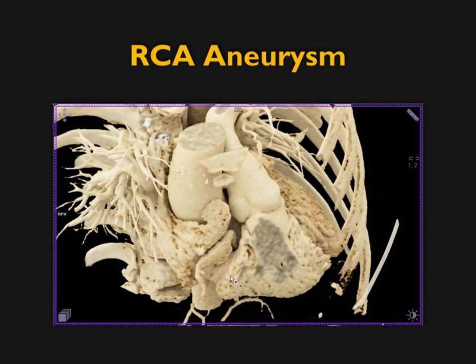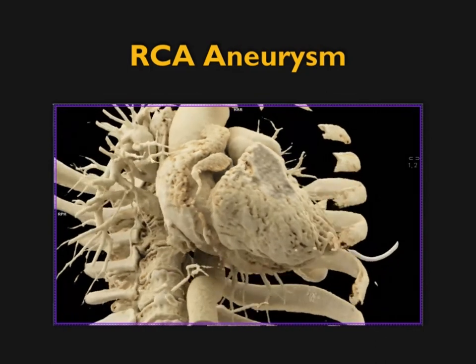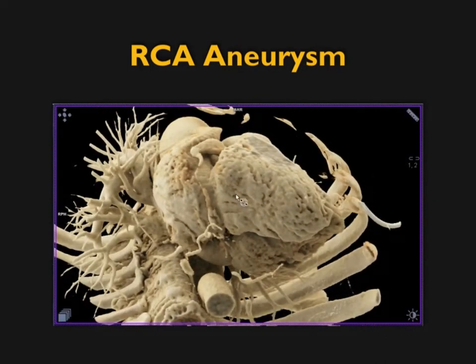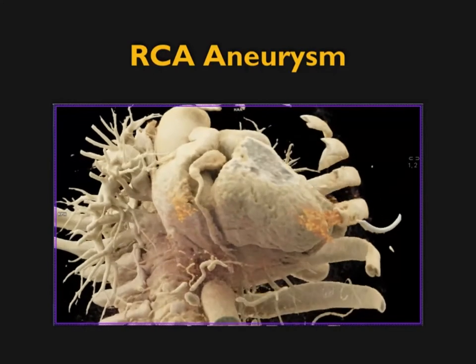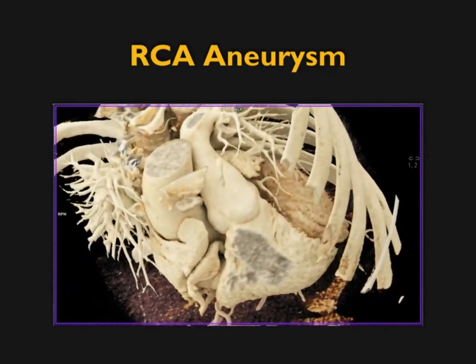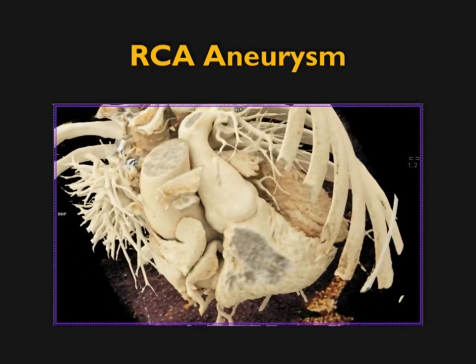On this next image, very much the same thing, same data set, but again showing you how we might decide to look at the data differently. You can look at the full 512 by 512 in real time, which is shown here. That's really impressive because not only are you showing the information, but you're able to change the information of the large data set in real time. And so the NVIDIA chips really push things along, and we use a 1080 chip.